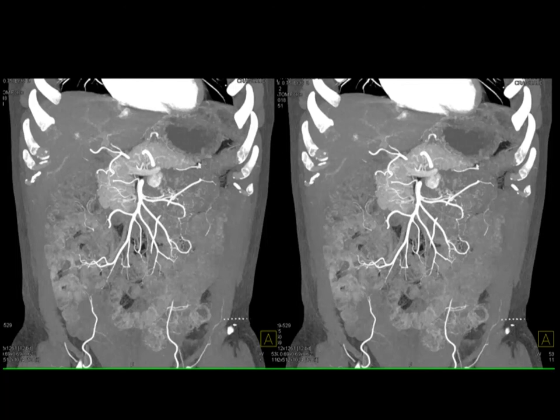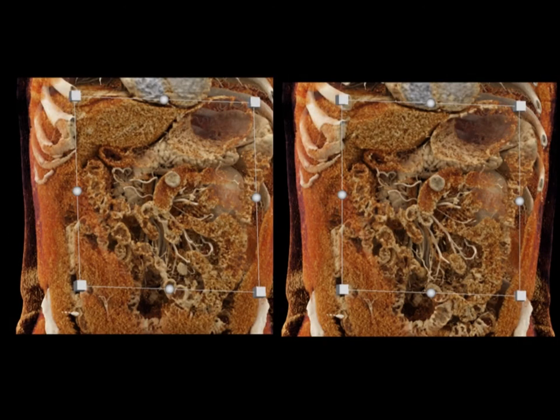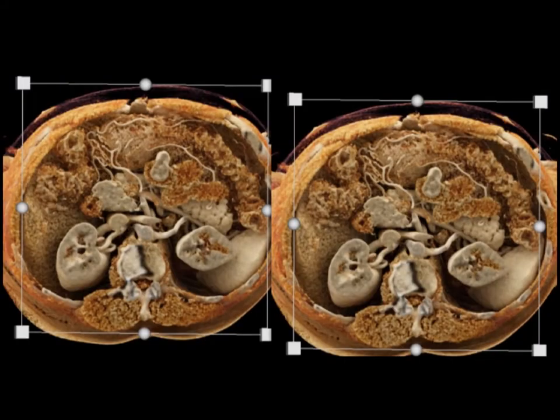It's beyond the bowel wall. Carcinoids are in the bowel wall intraluminal, typically. These GIST tumors are typically these exophytic lesions. Same thing is true in the stomach, right? But look how nice it shows here where the first cut shows it to you sitting exactly in the patient's lumen, like a polypoid mass in the lumen. And the second image shows you very nicely the image being within the lumen, but then projecting out that exophytic appearance, which is indeed very nice.